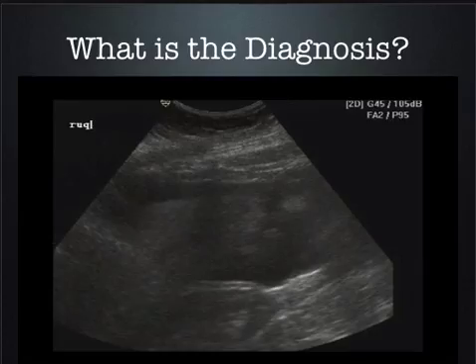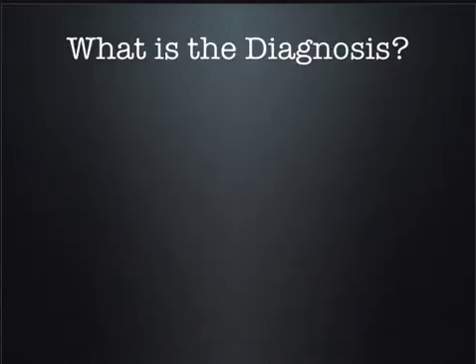All right, what about that? What is that? There's the kidney. There's the liver. It's floating in fluid. That would be good or bad? Bad, but you need to know the clinical context, right? So if that was the trauma patient, would that be bad? That'd be horrendous. If that was the young, healthy female that has an ectopic pregnancy, bad. If that was a psych patient, maybe not so much. So you can't tell the diagnosis from the image I gave you. You have to put it into the clinical context.